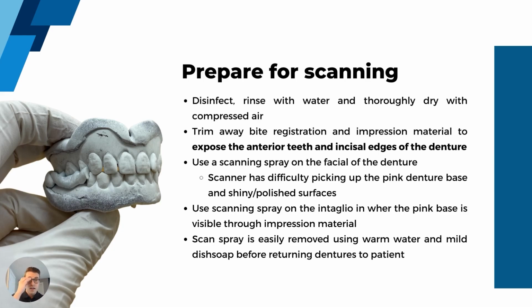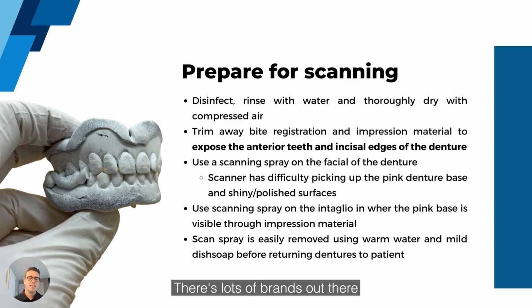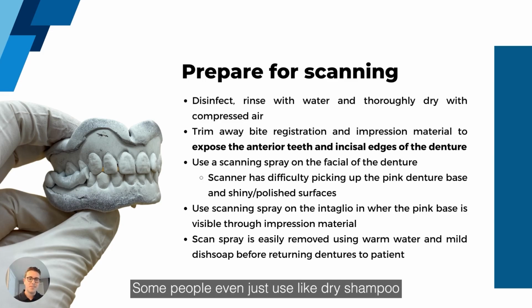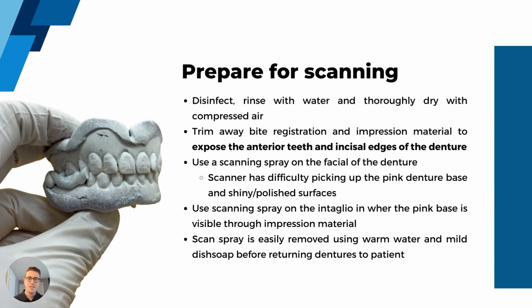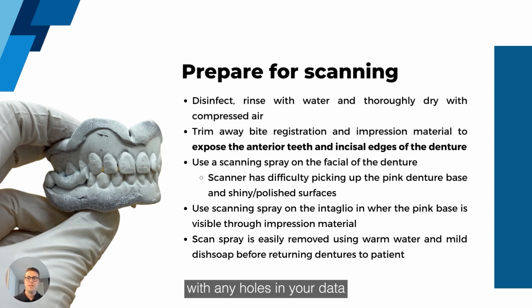So again, depending on the scanner that you have, you're probably going to have to use some scanning spray. There's lots of brands out there. Some people even just use dry shampoo to add some matte effect. But whatever you've got is going to work just fine. Just make sure that you're not ending up with any holes in your data. And don't be shy with the scanning spray. You can always just rinse it off with dish soap and warm water afterwards.